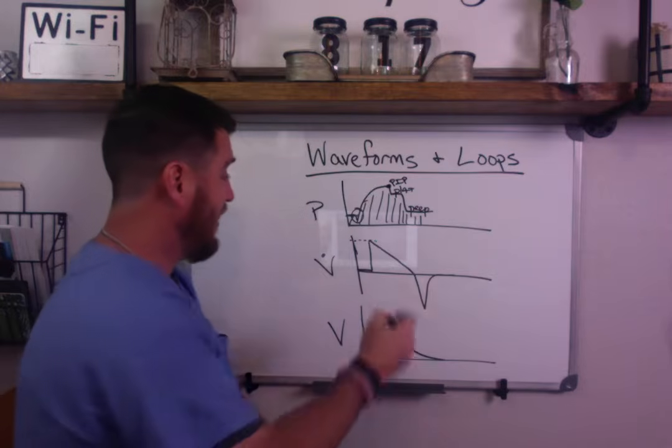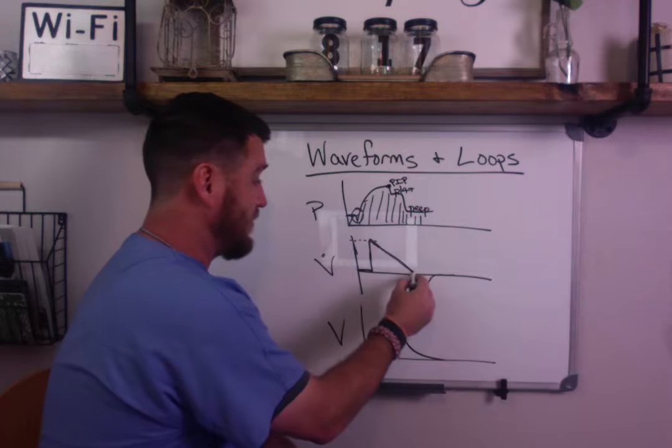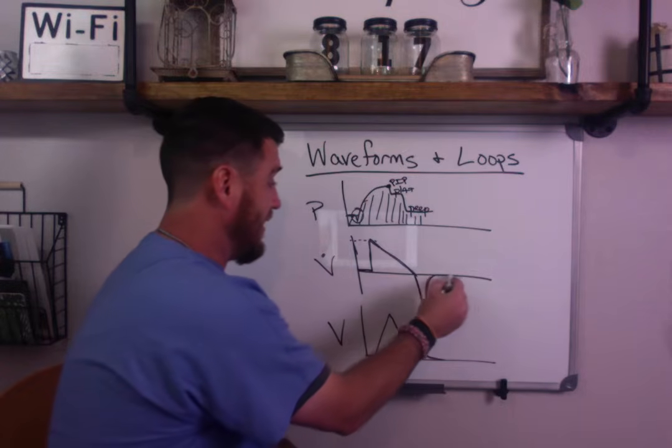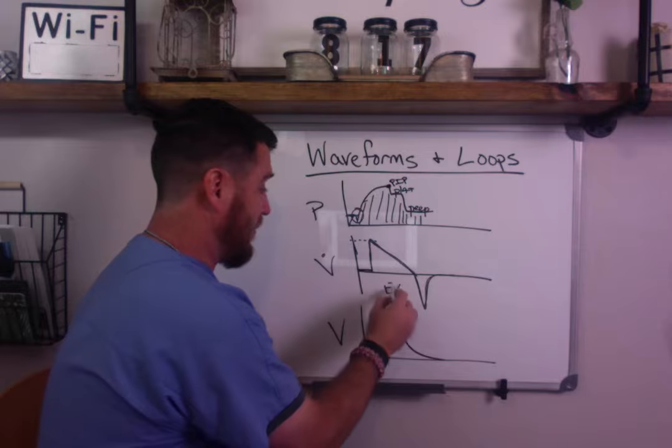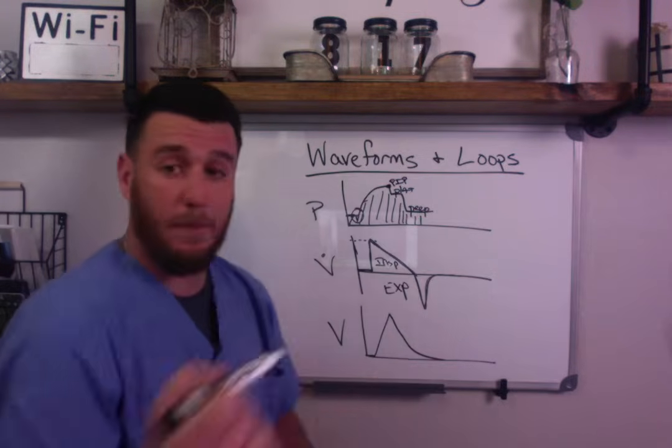And what we're looking for here is a rise and then a decelerating waveform that comes back to zero, and then expiratory on the bottom. This is the key. Inspiratory on top, expiratory on bottom.